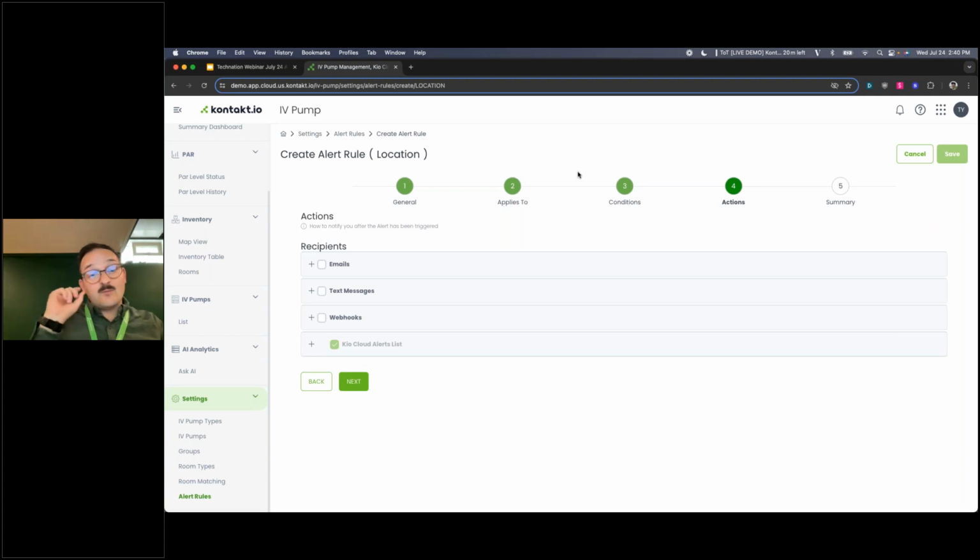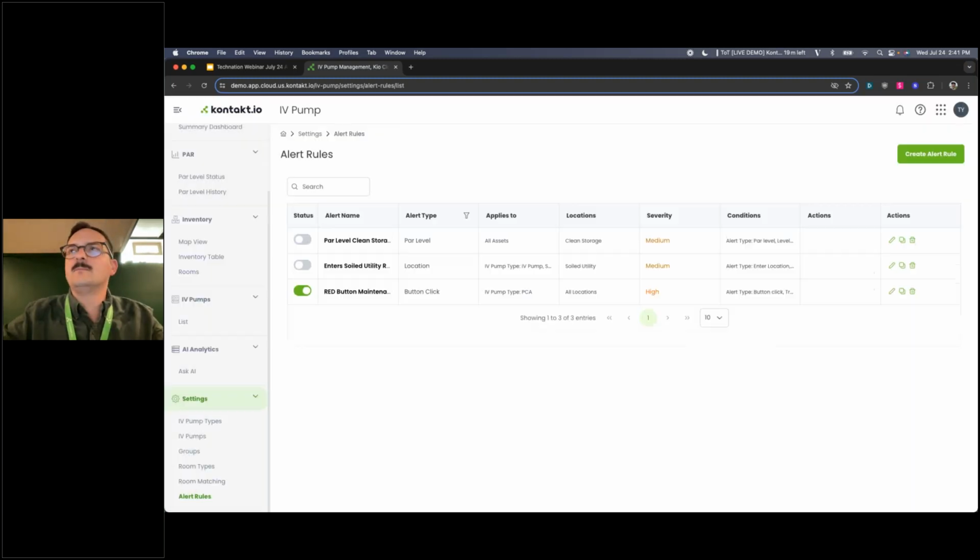You can also use that in an even more granular way to say, okay, if this device actually enters the loading bay, let me know as well, because that might be an actual decent indication that it's in the trash and we need to go and retrieve that. Or it's entered our laundry room. Let's make sure we're alerted for the incineration room. We don't want equipment there. Let's make sure that when they enter these specific locations, we're getting alerts to proactively let us know that expensive pieces of equipment are about to be gone forever. A lot of different ways to break out alert rules.